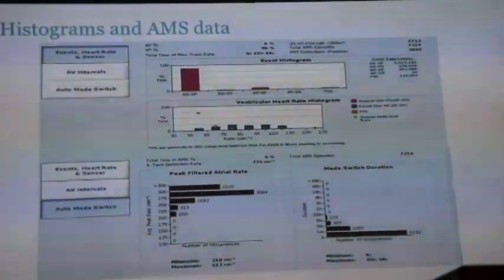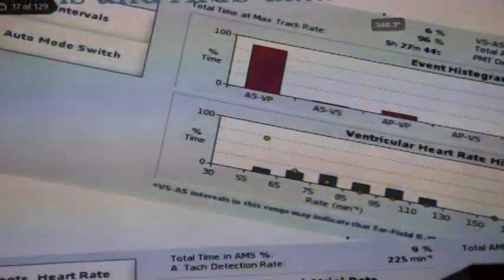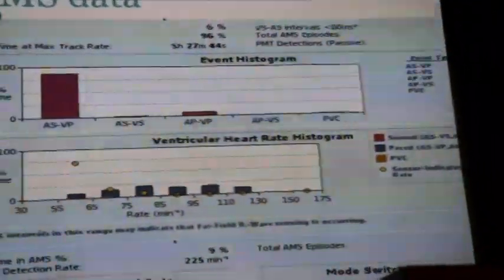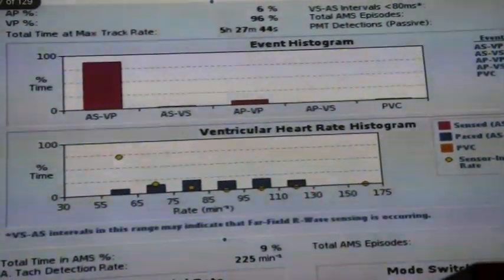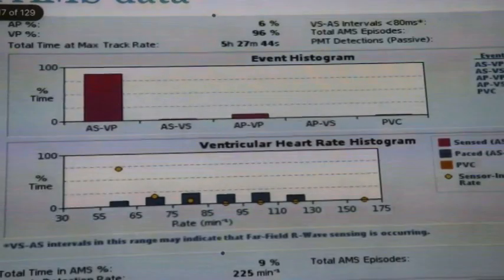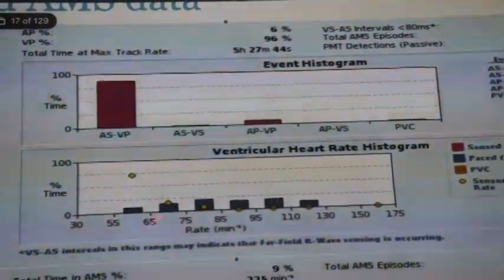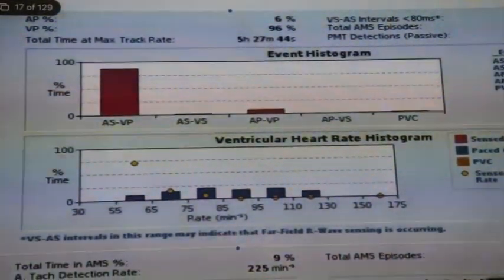Any comments about his histogram? Any comments on this? It says ventricular, it's atrial. There is no column with the average heart rate between 70 and 80, but all are going the same. The guy doesn't have any high heart rate. He goes up to 130. Remember, I think he has more heart failure than patient 50.